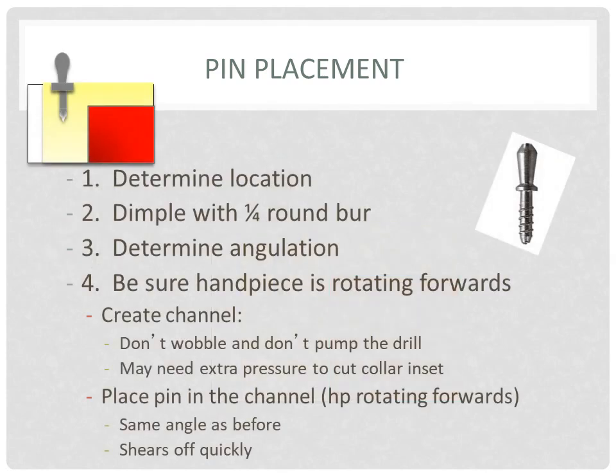If your channel former does not seem to be working, chances are the handpiece is rotating backwards. Channel formers do wear out, and if so, it needs to be disposed of in the sharps container.